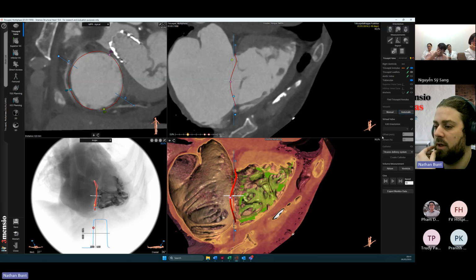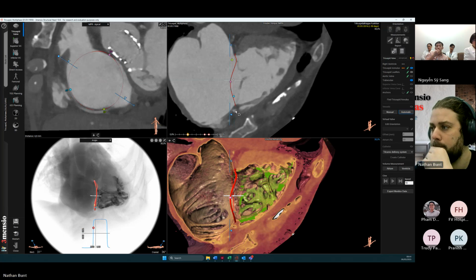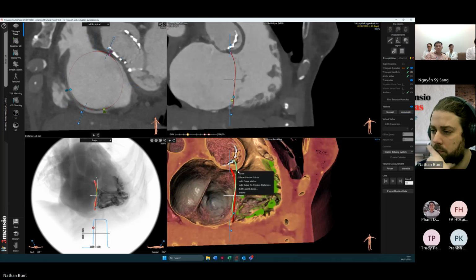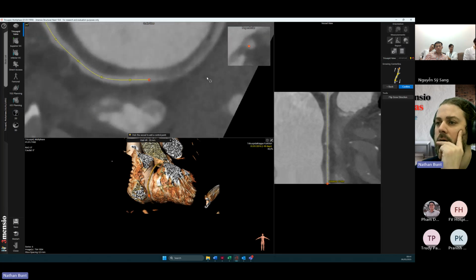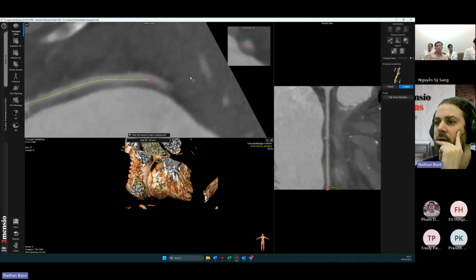Yeah. So if we click on automatic, we can hover over a vessel. This could either be in a short axis view, and then you can see at the bottom two views already a preview, or in a long axis view where we click, it will be locked in. All vessels can always be grown, so either automatically or manually defined, can just be grown, and then you'll go into the grow side step where you can elongate the vessel as you see fit.